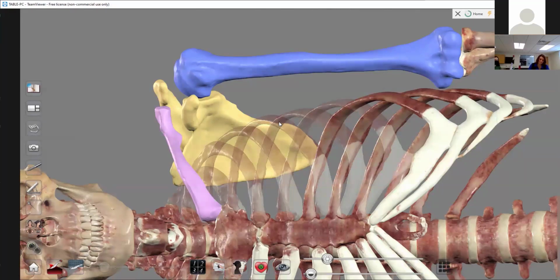They'll come up to the table and they'll have to color certain bones certain colors, and then submit an image of it in some of our activities. So flat color is pretty versatile and it's good for pointing things out.